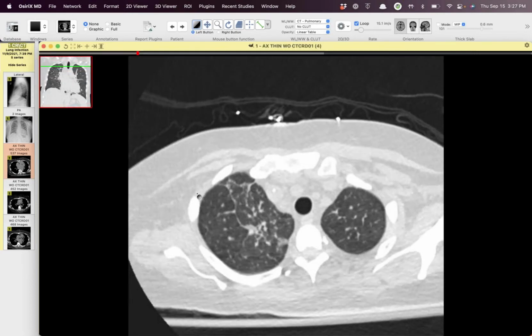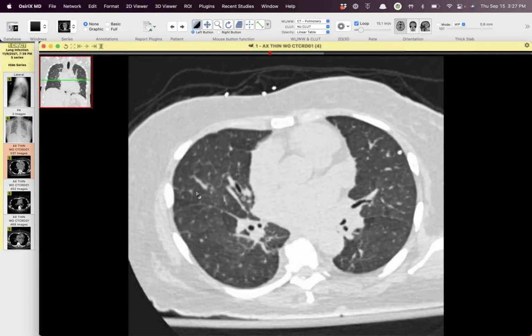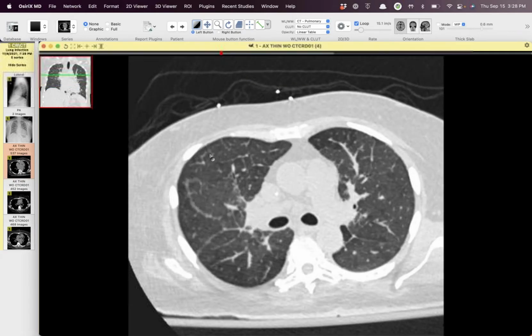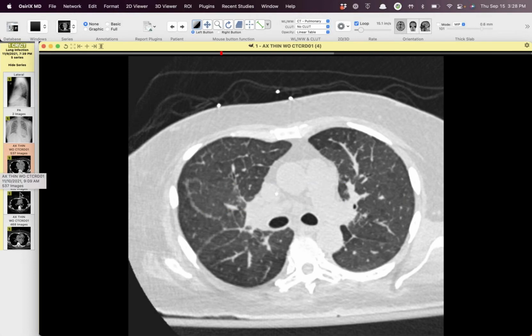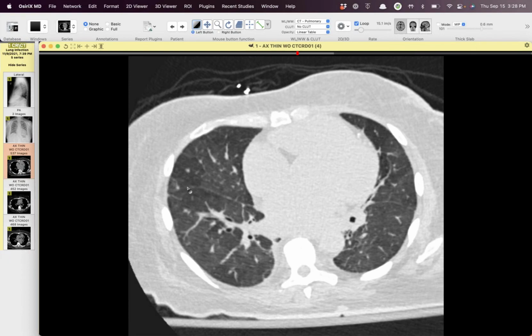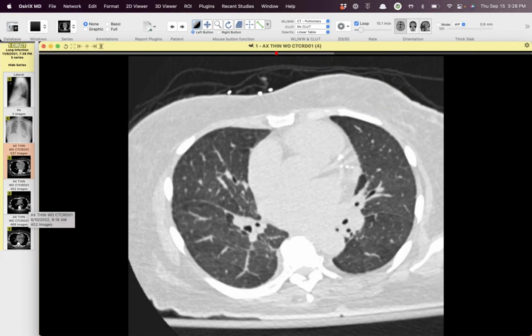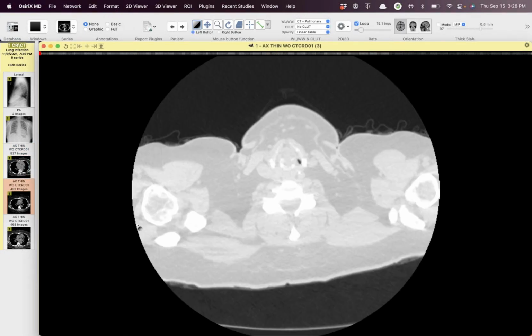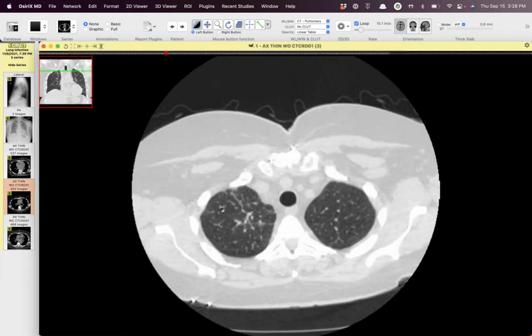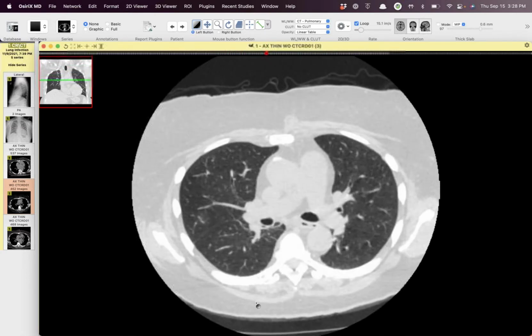All right, this next one, let me make sure we're going in the right direction. So this is a patient who, no, that's the old case. This is pre-heart transplant, so dilated, it was an ischemic cardiomyopathy. This patient got a heart transplant last year. And then this one, let me make sure I've got the right one. Yeah, this was earlier this year.